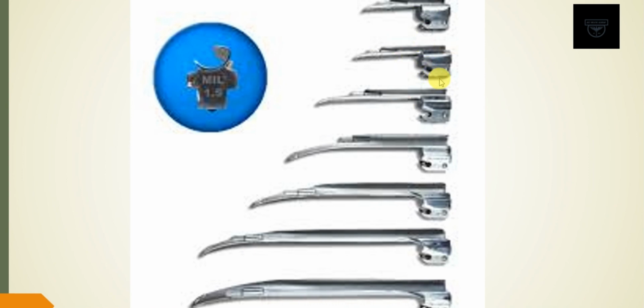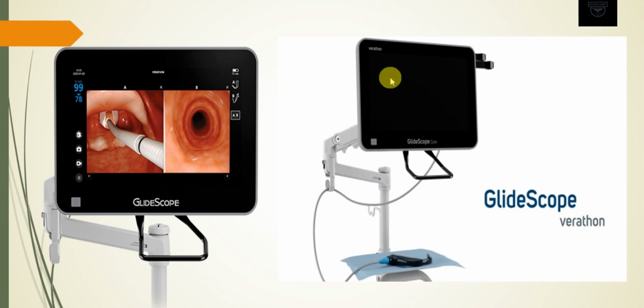It helps with the pediatric ET tube, which is usually uncuffed and suitable for these scopes. Another device which is great in intubation emergency situations is a glide scope. You can visually see the cords on a screen, and it's usually done in an emergency situation.